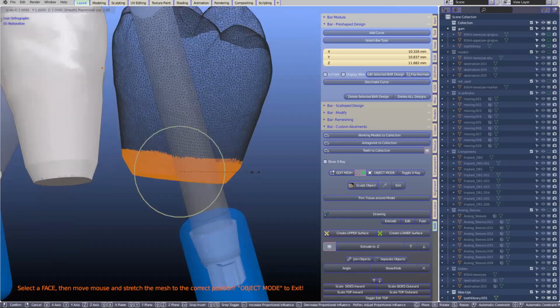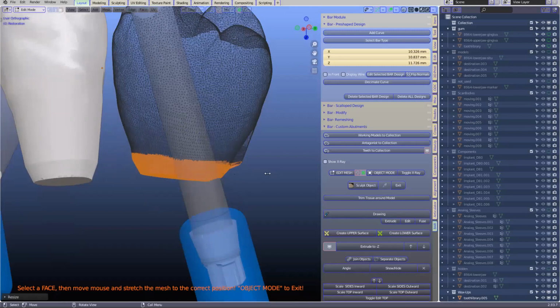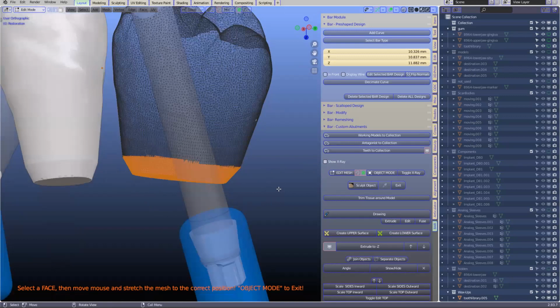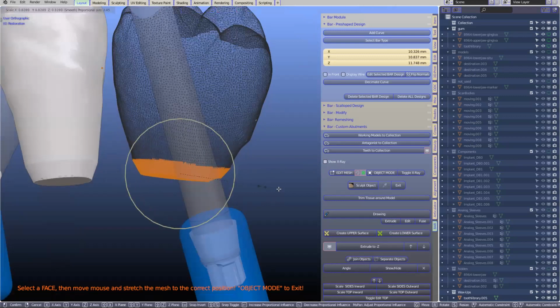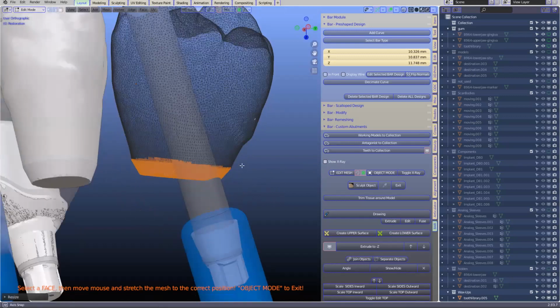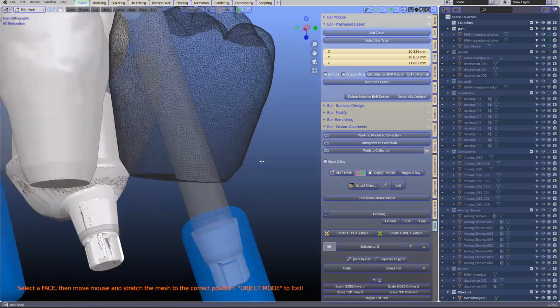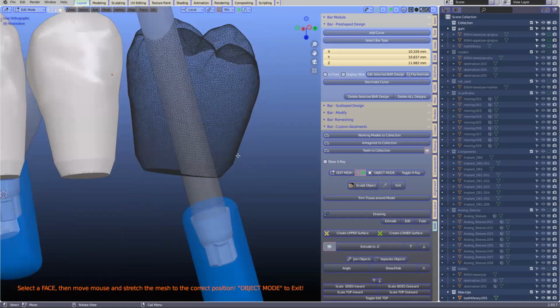Yeah, and you've got to make sure that the magnet tool is not on, because if the magnet tool is on, you're heading into problems. It sticks to the closest surface of any other object. 100% correct. Okay, so transparent on, scale it, and then just grab it down and plonk it onto the tube, correct? Yeah, that's correct.